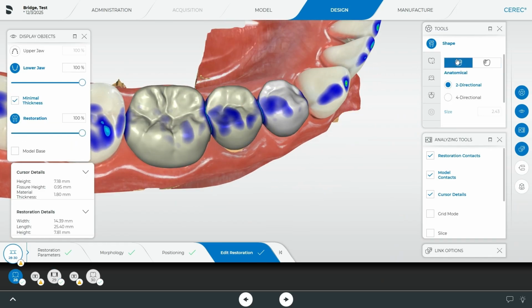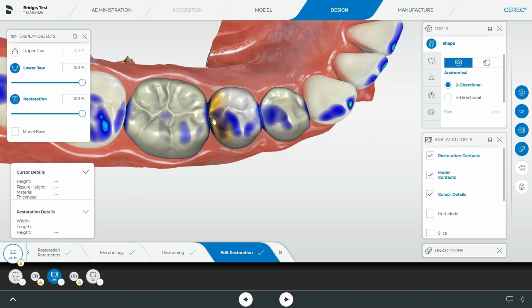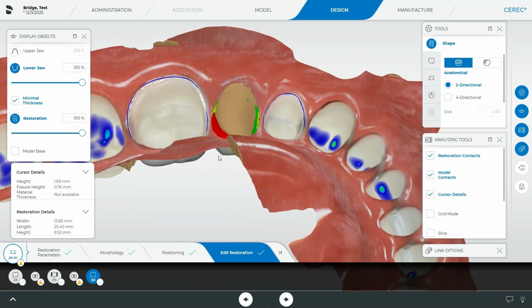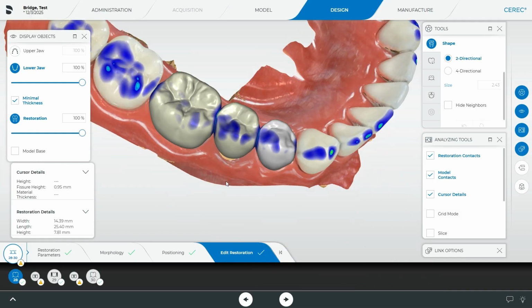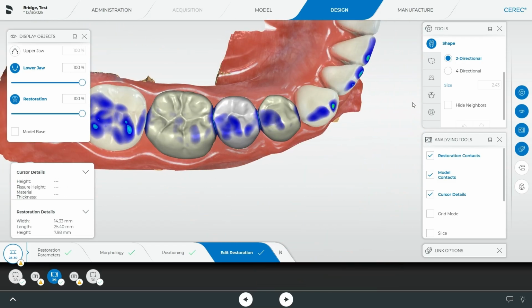And then I'm going to go to the anatomical tool to do the same thing we did with the other one, where this tooth looks like it's really coming into this space, and just get a shape that I think would be better for where the premolar should be. The hard part about the Pontic is getting a shape underneath the gum tissue that you're going to be happy with. And we've started with a model that has something that's smooth, but you can see that it's not touching very well there, so this would be a big food trap.